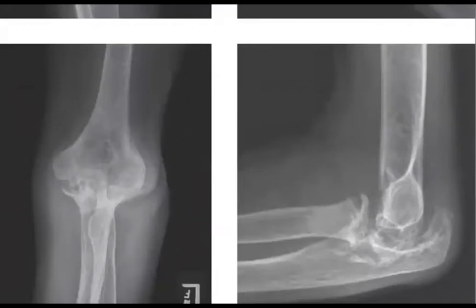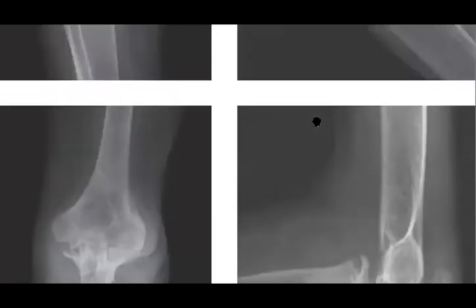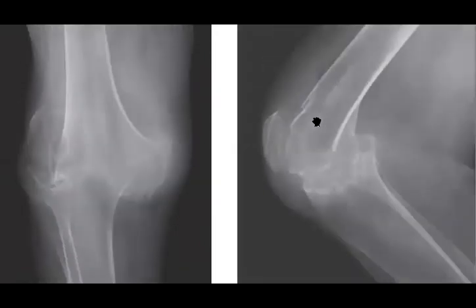The patient again has it in the elbow, you can see. Can be neuropathic as well. Yes, Charcot maybe. So this patient was a rheumatoid arthritis patient, but you need to describe the soft tissue swelling as well, and the erosive changes plus the displacement and subluxation.